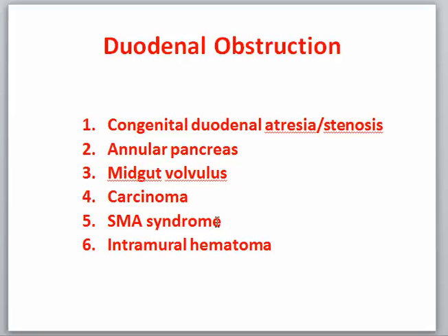which you find dilatation with abrupt stoppage of the barium like this, and it forms like a line, transverse line across the duodenum. This could be due to superior mesenteric artery compression. Here you don't find any infiltration or disease process in the wall. The wall is healthy, the mucosa is healthy, and there is abrupt obstruction. So superior mesenteric artery syndrome is more likely, but as we said, it could be due to annular pancreas, which is not the case.